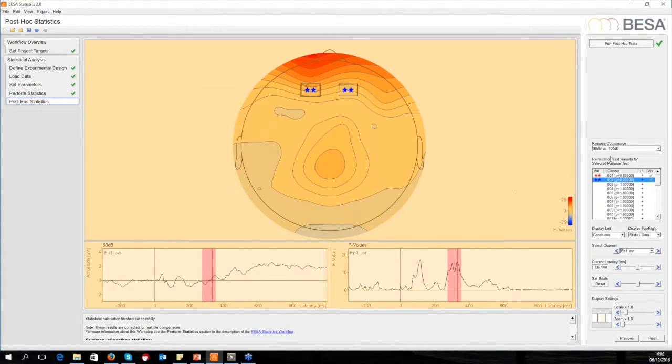Most of these clusters, if you look at it in more detail, will emerge as subclusters of the first large cluster that we found in the F-test analysis. All the results can be exported for more quantitative analysis and reporting. There's an export menu where you can either export images in high resolution or as vector graphics, or you can export the summary or the detailed results of the cluster statistics, which also show up here in the bottom information window.